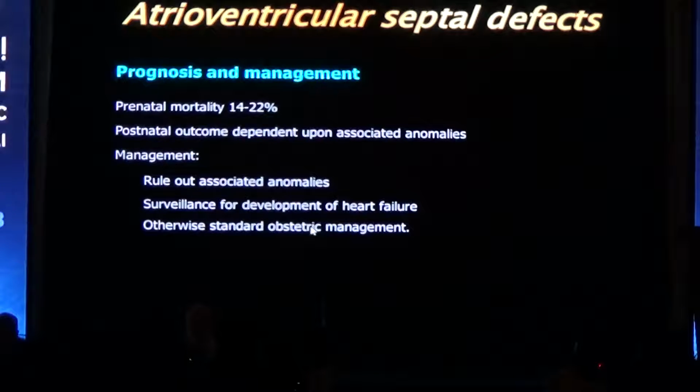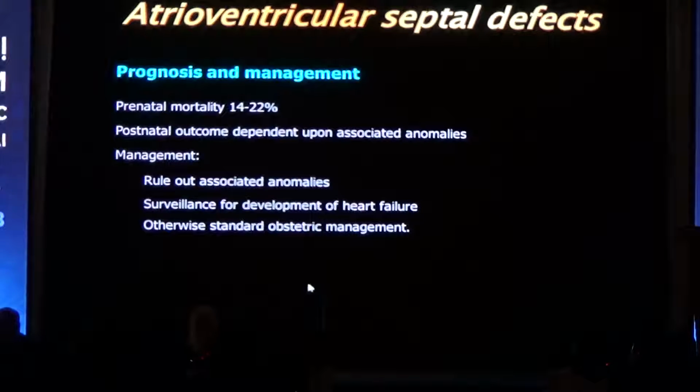And then the atrioventricular septal defect, the big clue is to make sure that the two valves are at the same level. This is the incomplete form. And if you don't see anything in the middle of the heart, the baby has the complete form. So this one I had to show you for the septal defect.